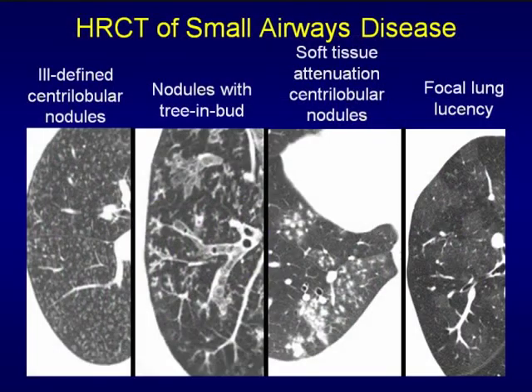So we've gone over these 3+1 patterns of small airways disease, why they look the way they look, and the differential diagnosis.